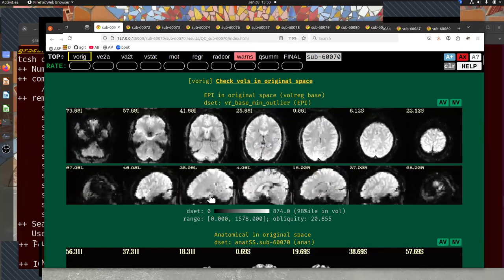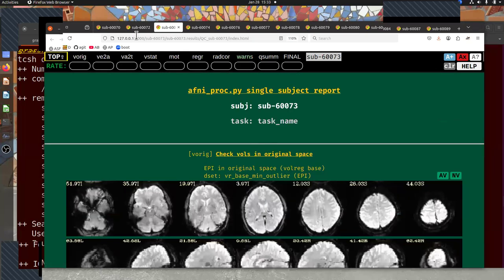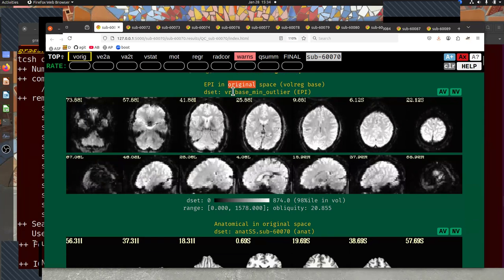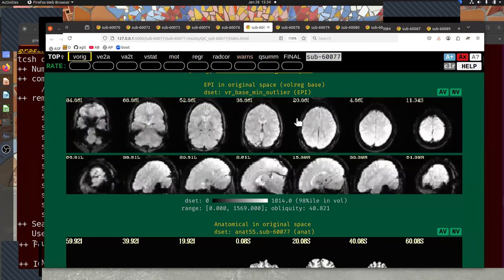Now the problem is that here's my data for this subject, it's here for another one, and if I scroll down to something, I'm in a different spot on all of these, and that makes me sad. What should be able to happen on your computer now is if you click any gold text and double click it, 1, 2. Now, if you notice, my page moved up a little bit, and now if I hit Control Tab, if I go across all subjects here, they're all in the same spot.